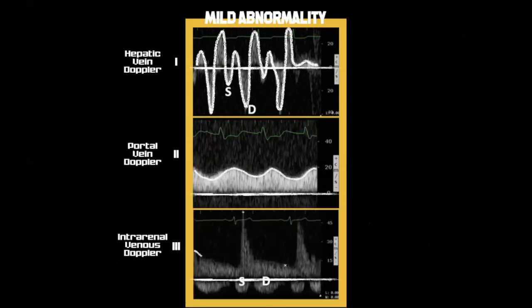What you start to get is a separation of your intrarenal venous flow. This has been described as the renal venous impedance index, where you can divide the peak of the systolic and diastolic components of flow. If you look below the baseline on this image that Johnny's drawn, rather than a continuous flow below the baseline, you've now got separate peaks.